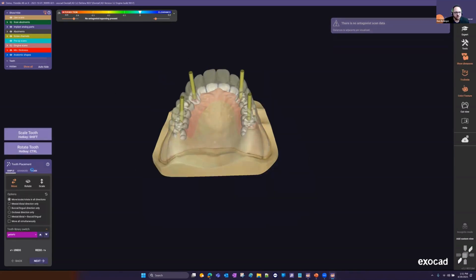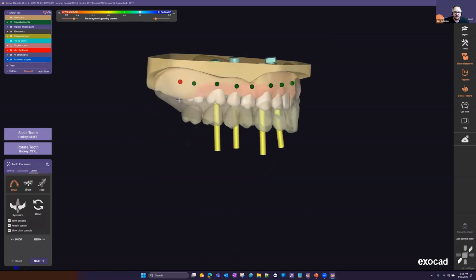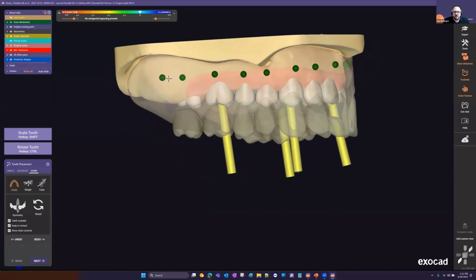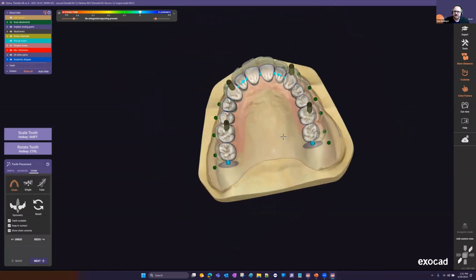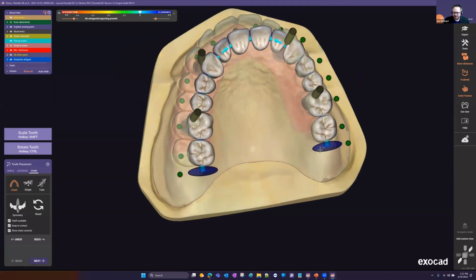Now, with tooth placement, we'll just go forward with the default generic library. Now, in chain mode, we have all these color points. You can toggle them by left clicking. Your control discs by default, these blue UFO discs here at the end, are what lock everything in place.